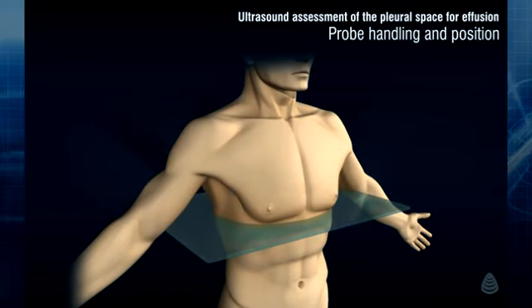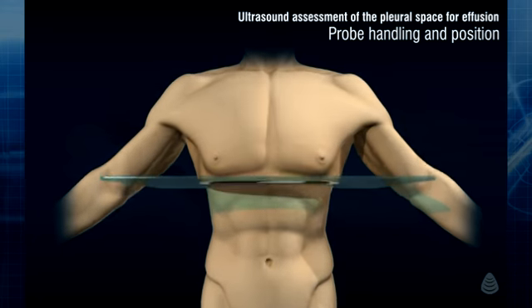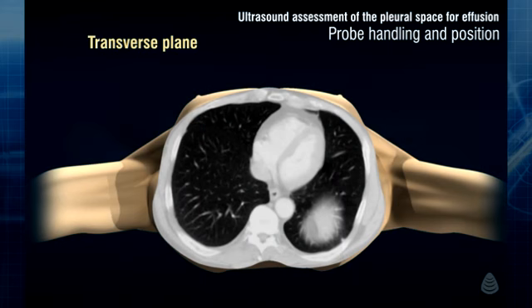Let's take a moment to better describe the thoracic anatomy obtained when scanning in the transverse plane of imaging. The axial plane is here obtained in the lower thorax. The transverse plane of imaging of a chest CT will here be shown to illustrate the anatomical structures and orientation of this plane of cut.